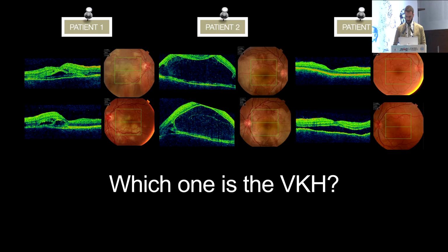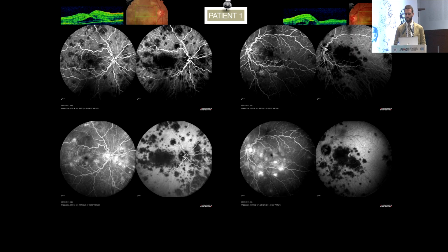So I'm going to start, for example, with our first patient here. Now, the first patient, you can see straight away in the fundus has some placoid lesion. So at this point, if OCT is not giving you the correct diagnosis, you go for dye testing. In dye test, you see something that blocks early in FA, stains late. So this is quite typical of AMPPE, and the ICG is showing us the choroid and choriocapillaris non-perfusion.